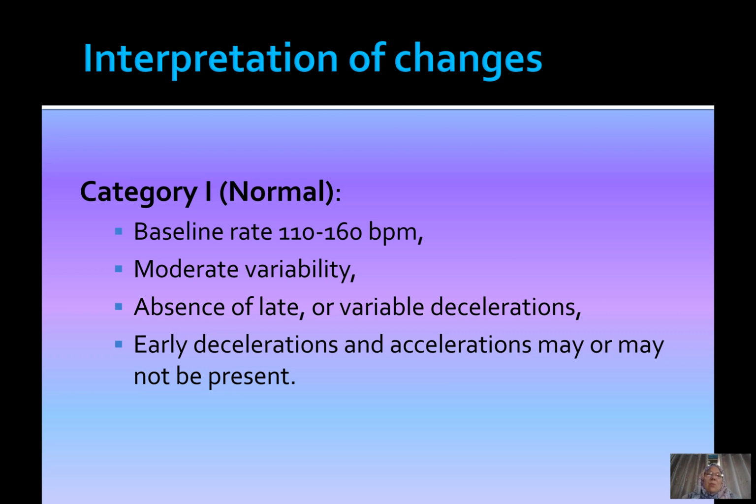Category 1 is the normal CTG, the one which is absolutely normal. We looked at it before. It does not require accelerations, but if there are accelerations, this is very reassuring. Okay, so early decelerations, accelerations may or may not be present.